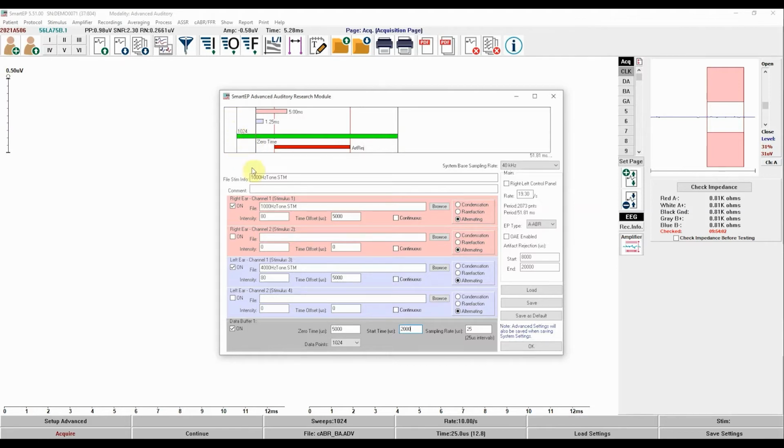If additional data is required, increase the number of points using the Data Points drop-down options: 1024, 2048, 3072, or 4096 data points. New delimited green horizontal segments will appear on the timeline for every 1024 points added. However, these will result in a single plotted waveform.